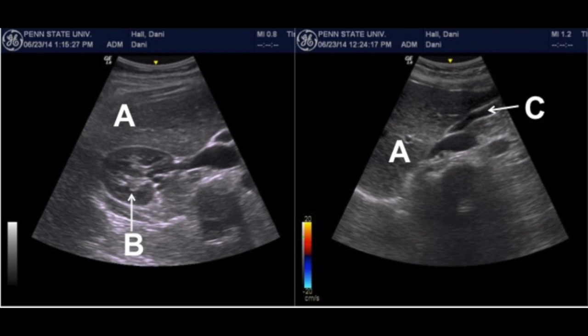To get you oriented with this image, the structure labeled A is the liver, the structure labeled B is the kidney, and on the right side, the structure labeled C is the gallbladder. As you can tell, it's more visible in structures B and C, the kidney and the gallbladder. If you look around the outside of those structures, you can see the thin white lining of the fatty tissues, and those will be the hyperechoic tissues.